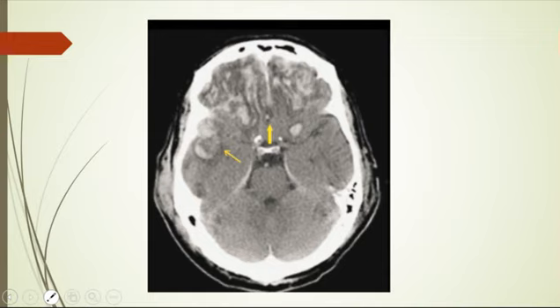So, this is an easy one. Diagnosis: parenchymal laceration and intraparenchymal hemorrhage, due to contusion, of course. So, what is the appearance called? This is what's called a mottled, flecked, or salt and pepper appearance. Okay, of the brain, not of the calvarium. That's a whole different story. We are talking about the brain.